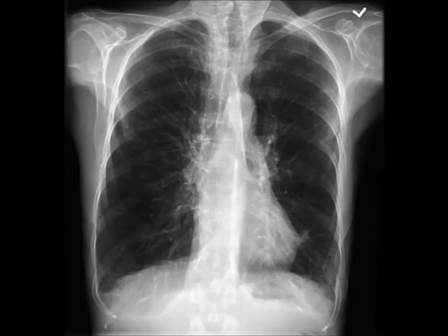First thing to comment on here is the technical quality. The patient may be rotated slightly, although it's difficult to tell, and it's hard to see the intervertebral spaces through the heart, suggesting underpenetration. The most striking thing to note is that the lungs are overinflated, with the 8th anterior rib intersecting the diaphragm at the mid-clavicular line. Going through our system shows that there are flattened hemidiaphragms on both sides with blunted costophrenic angles. And you can also see some small areas of increased opacity in the hilar.